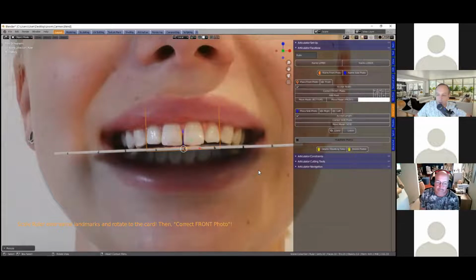These photos are just taken with an iPhone. Of course, if we had 3D scanners that can take facial scans, you can do it that way, but it adds to the cost when you can just take a photo and get quite good results this way. So if you run out of cards, please don't use your credit card. Your patient may chew it all up or something.